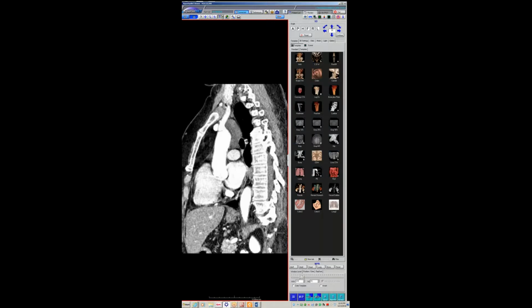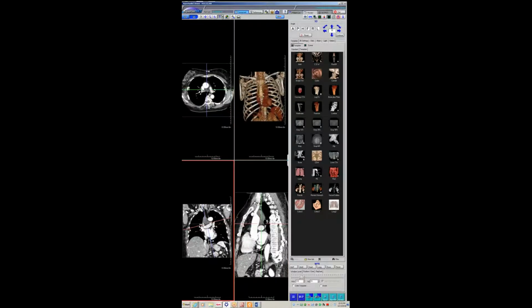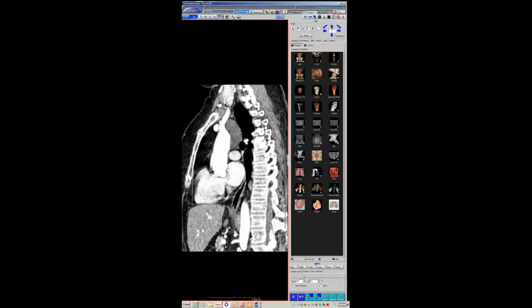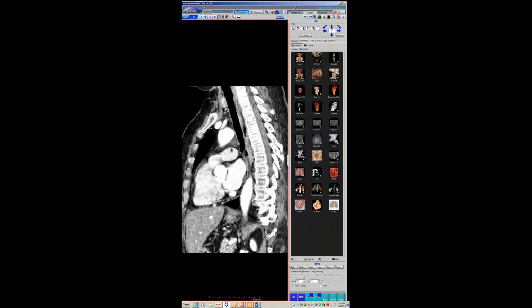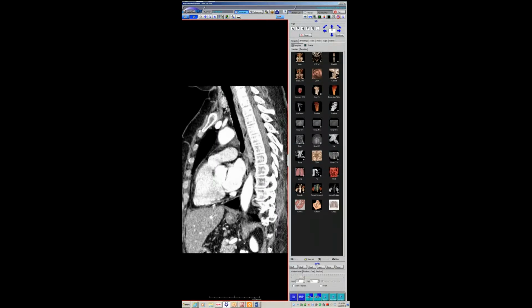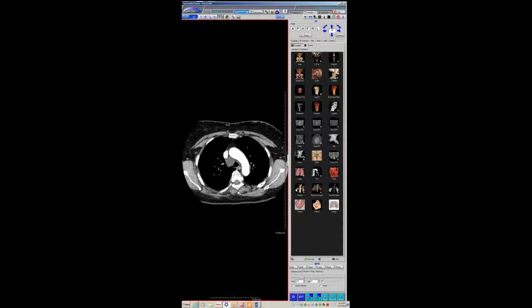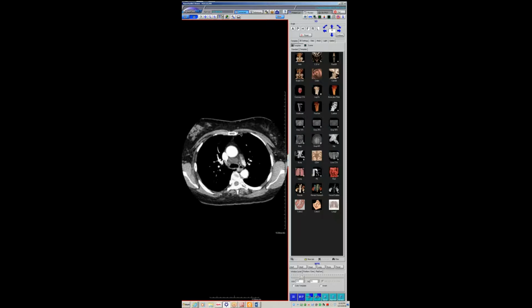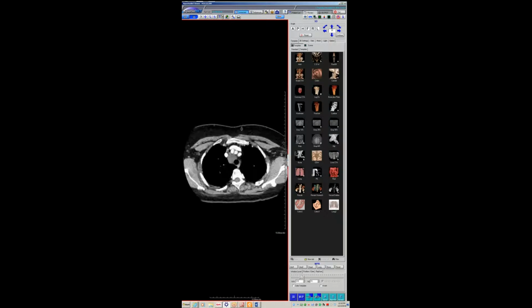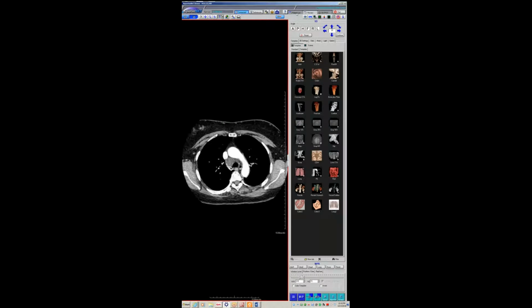But sometimes with this outpouching, the ones I've seen have been much smaller than this. They go in the same exact location every time, the same appearance. I've seen them go this high, but one this filled, I've not seen. And again, you can see it coming underneath where the aorta crosses over the PA. Unfortunately, it often gets called a cyst or some other abnormality that would lead to median sternotomy and them trying to resect basically an outpouching of the pericardium. So anyways, that's an interesting one of those.